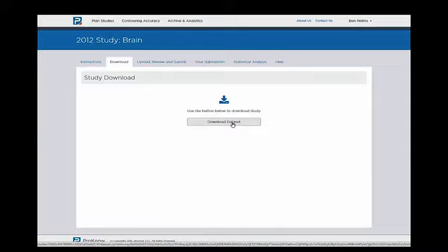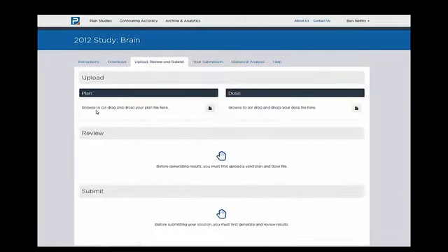Different rules for different planning systems on how to get the DICOM in, but we've run these types of studies with all the major planning systems, and this is definitely possible, in most cases extremely easy to do. We'll leave those details to be documented in the instructions. For the sake of this demonstration, I'm going to go next to "I'm ready to upload, review, and submit your first plan try." So it allows you to then select the plan and the dose.